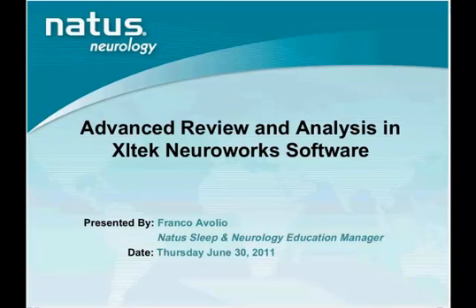My name is Franco Avolio, and I am the Neurology and Sleep Education Manager with Natus Medical. Today's session, we will be talking about a number of features that are available in NeuroWorks. Some may consider these advanced features, others may not, and so I apologize ahead of time if you find some of these features a bit redundant, but for some of you I know this will be new.